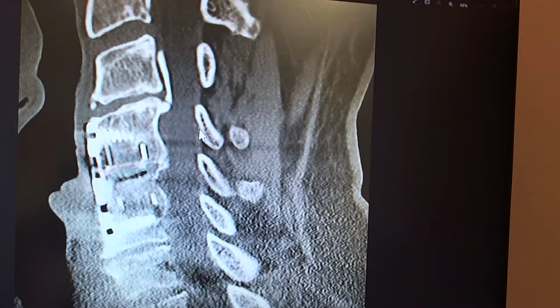Patient had, here you see from the form of that, almost a pyramidal kind of shape. So in that sense, I'm assuming this is the C2, but as well you see a very large spinous process. This spinous process is large, and that indicates that's the spinous process of the C2.